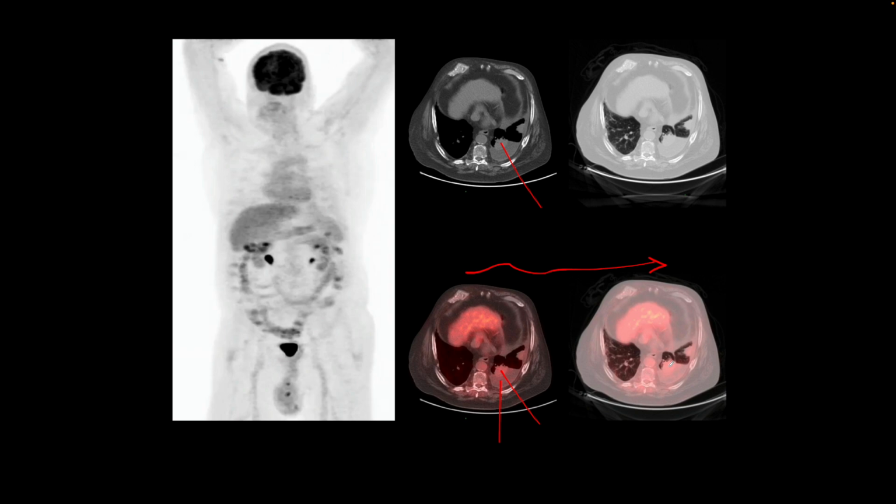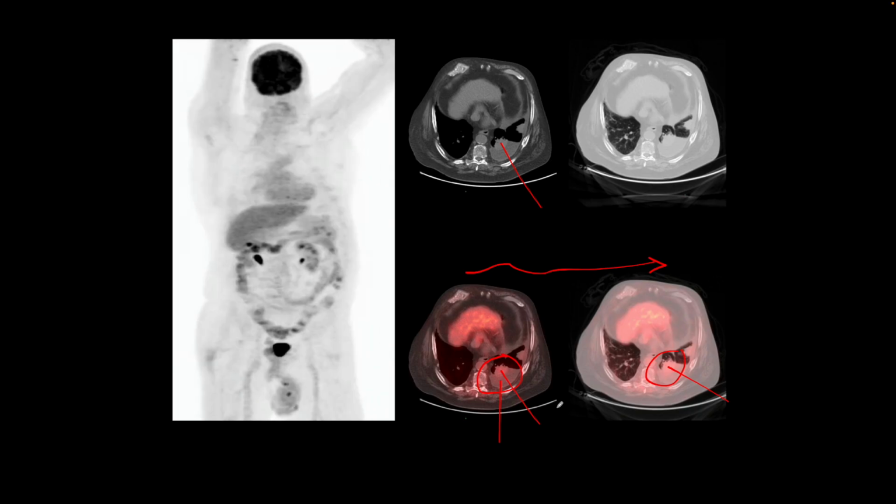And here it's the same image in the lung windows shown right here. So FDG PET-CT is a good modality to evaluate if there are any underlying lung masses where anatomic imaging shows just lung collapse or atelectasis and an underlying mass cannot be ruled out. Here, because there is no focal hypermetabolism, the finding that we see on the CT is just from the collapsed lung or atelectasis secondary to this pleural effusion, and there is no FDG avid tumor.